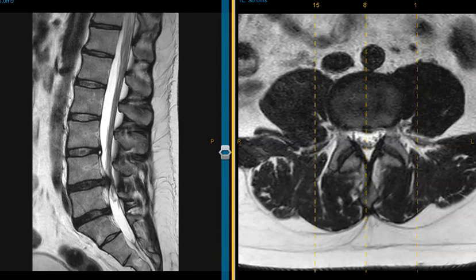And this patient just has a classic, nice example of a disc herniation. And we can see here a normal disc, a nice cushion. These squares, these bones are nice and normal appearing. And the disc material looks bright, which is normal. And behind the vertebral body, we see an area of brightness. This is fluid in the spinal canal.